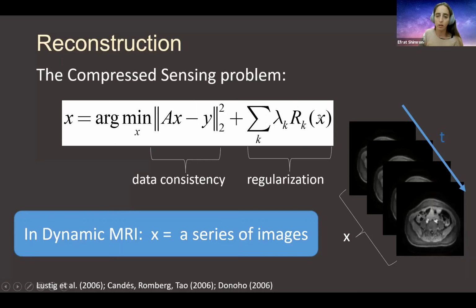Then we can use a regularizer for sparsity in the wavelet domain and add to it a regularizer for the temporal domain. This example, which I just described, appears in these slides in the additional part, and it also appears in an additional Jupyter notebook. You can have a look at it.